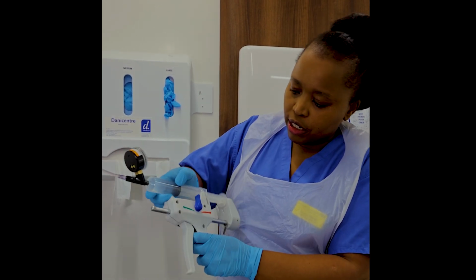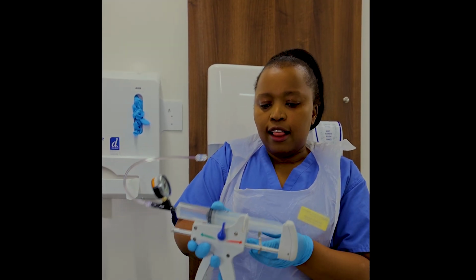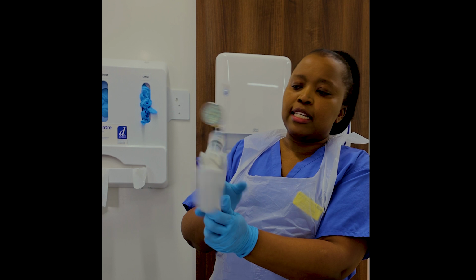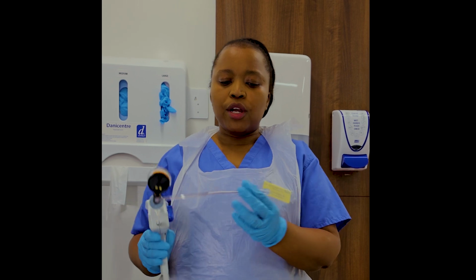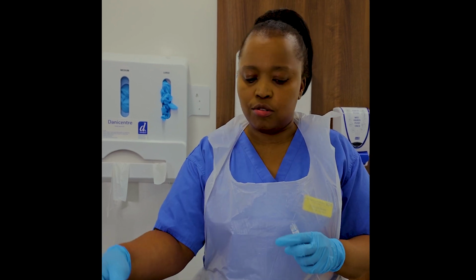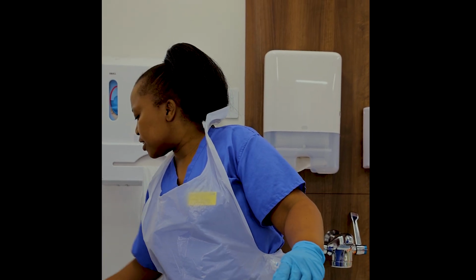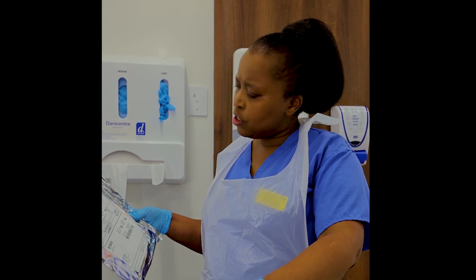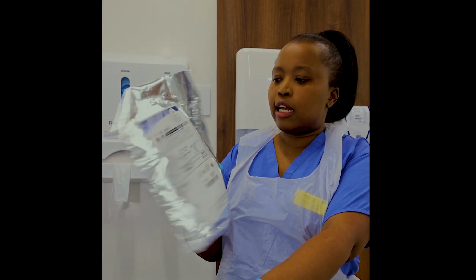So I'm patching this now. We just patch this in through like that on the neutral position, okay? We have got this to lock it in, so it's all locked up nicely. And this is actually facing up the gauge. So what we have to remember is we are going to connect this to our balloon. I have been asked to get the balloon. And then, like I said, the balloons are in different sizes. This balloon which I got is size 10 to 12. This is the one I have opened already in advance. You need to make sure it has not expired.